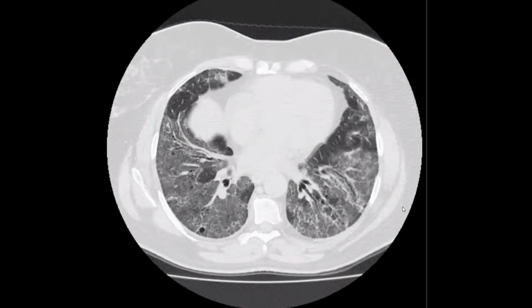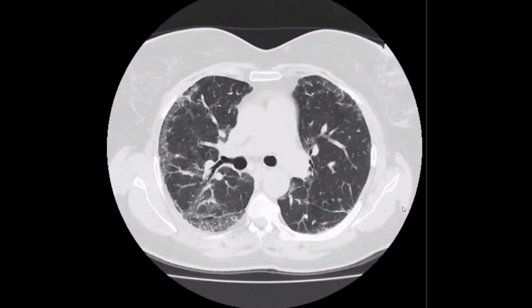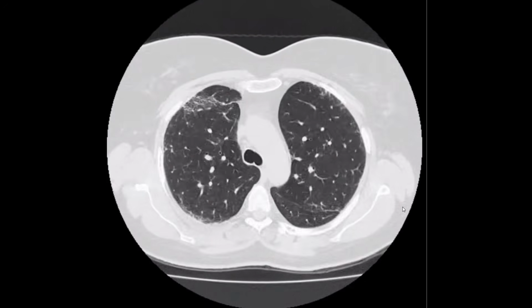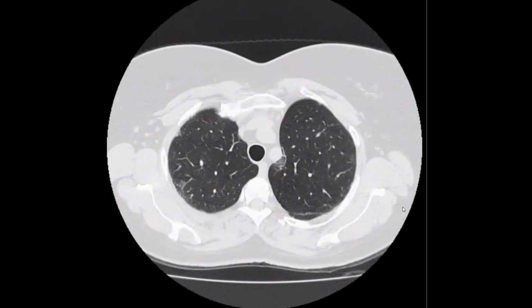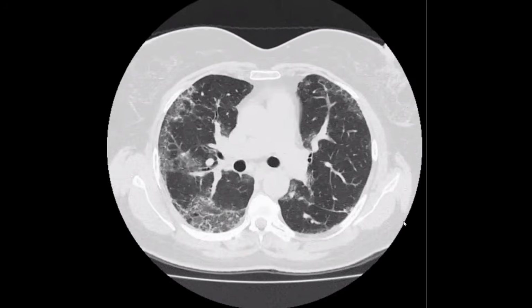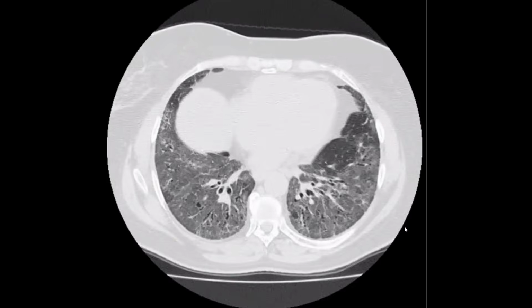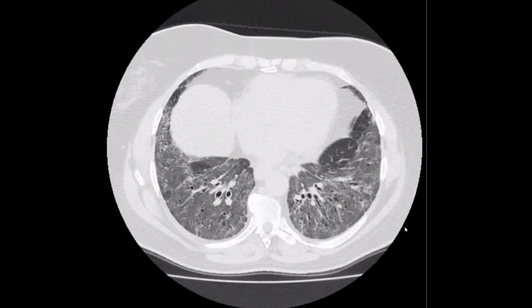So I can also appreciate that there is no inter or intralobular septal thickening noted. No mass is seen, no consolidation is noted. So on these imaging findings, my diagnosis of bilateral symmetrical ground glass haze with bronchiectatic changes, it could be interstitial lung disease. It could be, in the lower lobes, most pronounced is the non-specific or hypersensitivity pneumonitis.